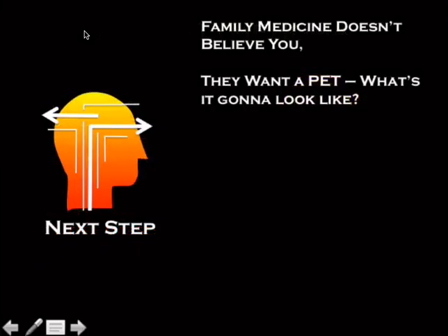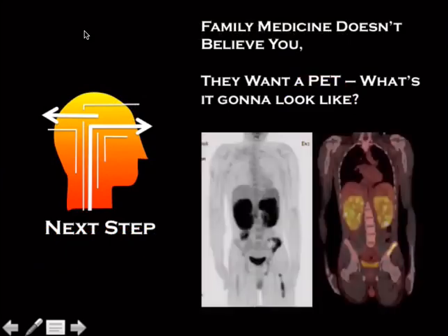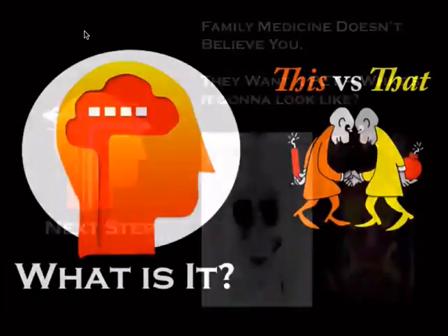So what's it look like on PET? Well, just like lymphoma anywhere else, it's avidly enhancing, super duper avidly enhancing. So there's really nothing else that's going to look like that in the kidney.